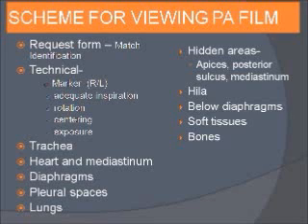We should see the mediastinum. We should then comment on the hila. Then we should try to see below the diaphragms also. Although it is part of the abdomen, there may be findings there. So we should also look at the upper abdomen, like the gastric fundus or the presence of any free air like pneumoperitoneum. And then we should see the chest wall for bones and for soft tissue.